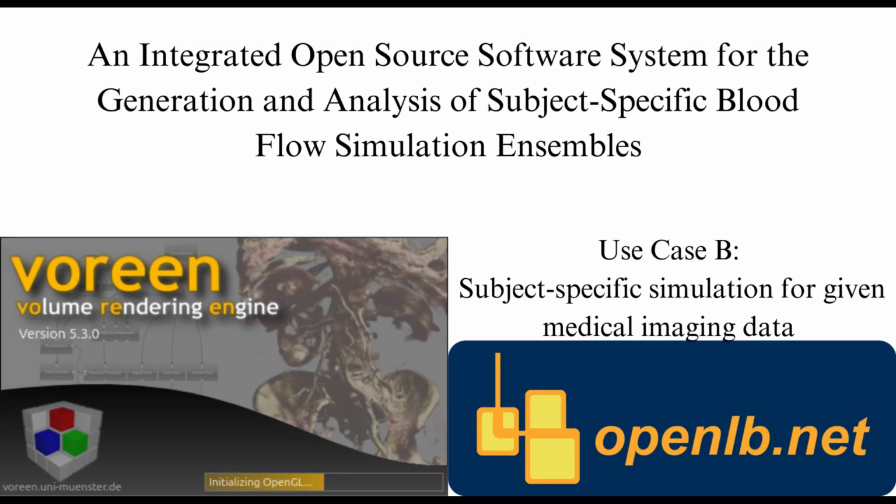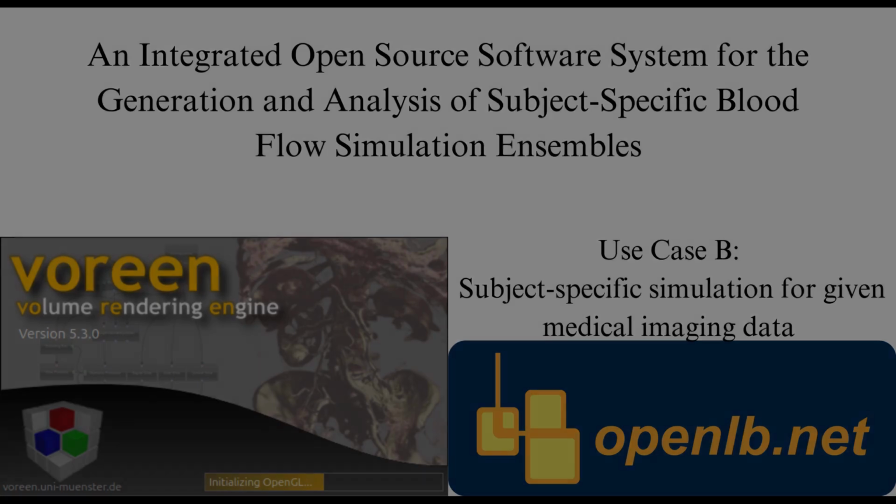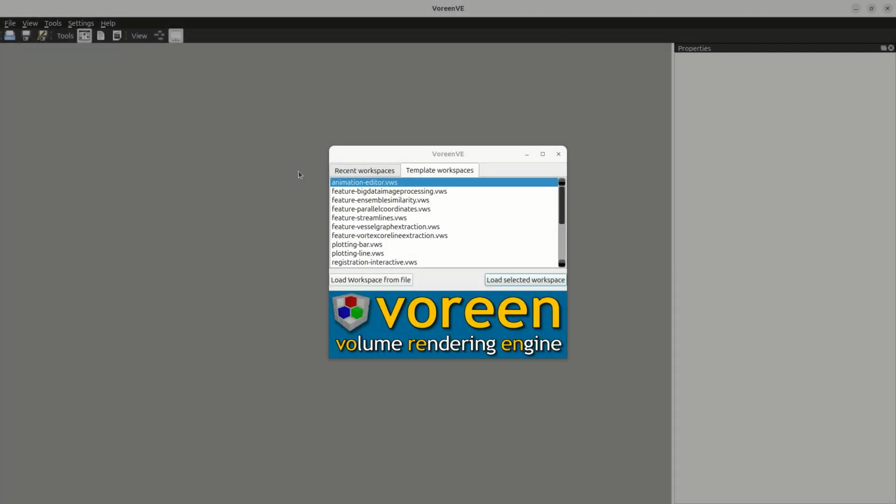Hello everyone and welcome back to the introduction of our Voreen use cases. This time we will present use case B, a subject-specific simulation based on medical image data. We begin by demonstrating how to obtain segmentations with Voreen.